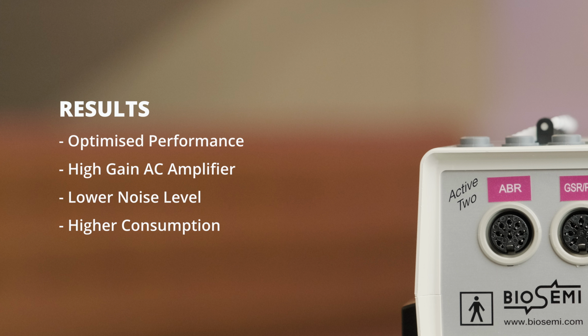Let me say something very important. As we analyze the data, what I've just read out will make it clear when we look at the two data sets using the LMON, the REV and the RMON, which act similar to EEG electrodes, whereas the left and the right electrodes will show much different signal quality.